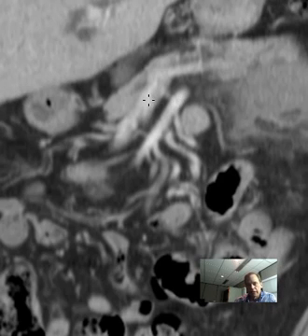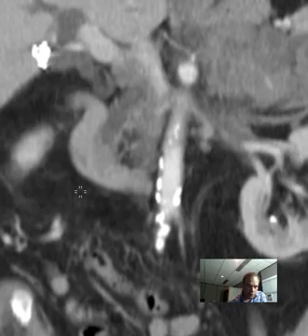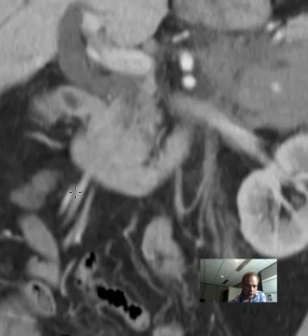So you have the SMA and the SMV, and they are receiving tributaries respectively from the arterial and venous supply to the bowel. So if you go out farther, you'll see these little branches branching further and further and terminating in these loops of bowel.